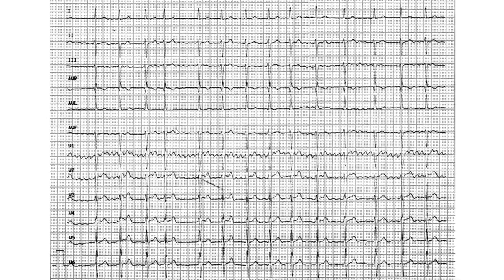Again, just peek over here, you can tell it's definitely non-sinus. Also, we don't see any P waves. Point 3, heart rate: 1, 2, 3, 4, 5, 6, 7, 8, 9, 10, and so on. The heart rate is going to be like 14 by 6, 84. So that's 84 is the heart rate.